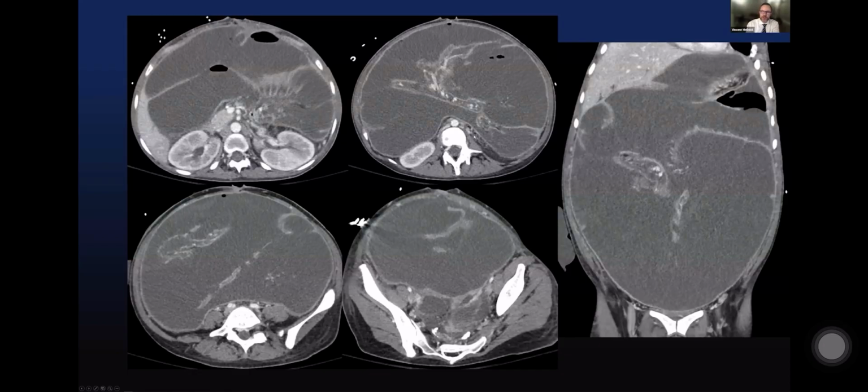As an aside, this patient is also developing abdominal compartment syndrome. Her inferior vena cava is flattened. You can see small caliber of the pelvic vessels here because the pressure inside the peritoneal cavity is in fact so high that other organs are getting ischemic as well.